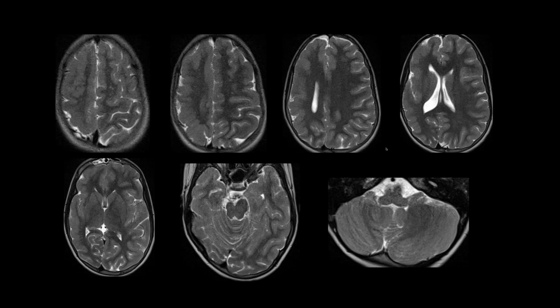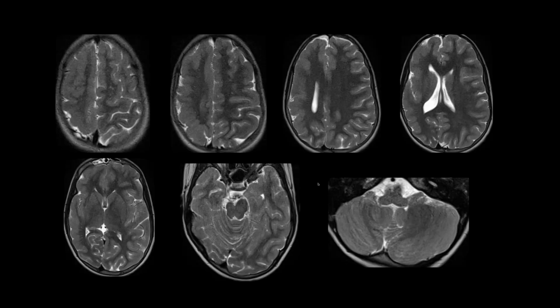This is not genetic. It's strictly unilateral, if I understand correctly. Usually the cerebellar hemispheres are symmetrical, but in terms of hierarchy, I think the main finding is the strictly unilateral situation in the brain. I would expect that this child has some mild hemiplegia, hemiplegic cerebral palsy on the left. I'll check with the clinicians, doctor. But yeah, I would agree with you. It's probably an acquired insult resulting in these changes.